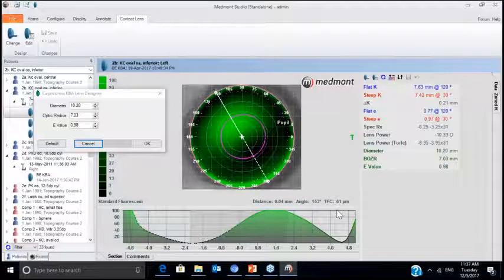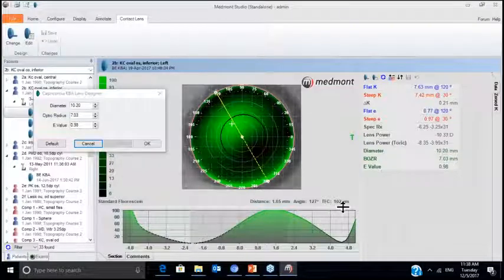And we said that when the elevation differential is greater than 350 microns, that's where a corneal GP is typically going to struggle. So just for fun, let's put on a corneal GP lens and let's see how it might look. Let's place that lens on, model the fluorescein pattern, and determine if this lens could be an appropriate fit.